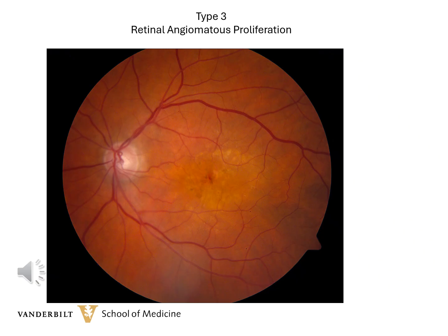Note the central light retinal pigment epithelium, and this is from a pigment epithelial detachment, which oftentimes goes along with the type 3 choroidal neovascular membrane. Also, notice there is a superficial hemorrhage centrally. Superficial hemorrhages are a hallmark of type 3 choroidal neovascular membranes.